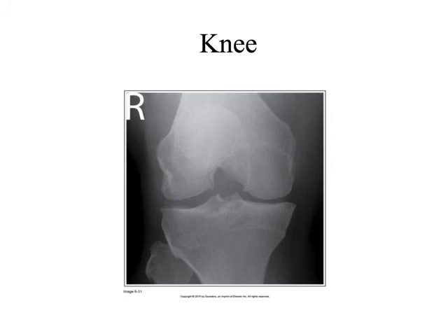So the medial and lateral surfaces of the intercondylar fossa are going to be seen in profile, right? And then we want to see those proximal surfaces of the intercondylar fossa superimposed. And then this knee joint open with the tibial plateau and the intercondylar eminence seen very nicely and cleanly. And then we want that intercondylar eminence more or less at the center of the exposure field and an appropriate marker in the appropriate place. Okay?